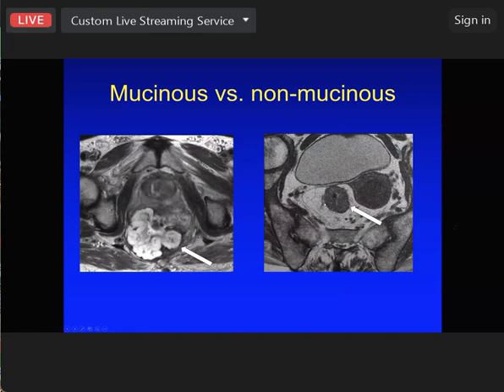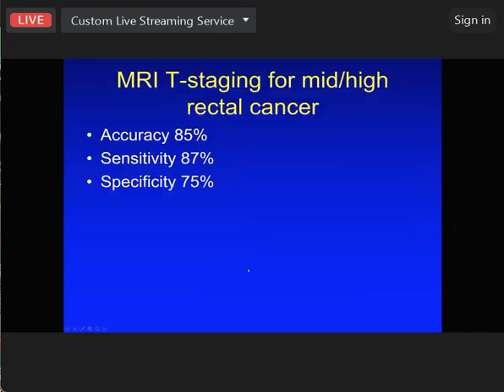So here is the circumferential tumor of the rectum. There's the lumen, it contains air, it's dark. This is all tumor. This is the muscularis. And surrounding this, you've got the mesorectal fat. This is a female patient. I think this is the uterus here. So this shows the contrast between mucinous and non-mucinous, and we'll have a bit more to say about that in a minute.